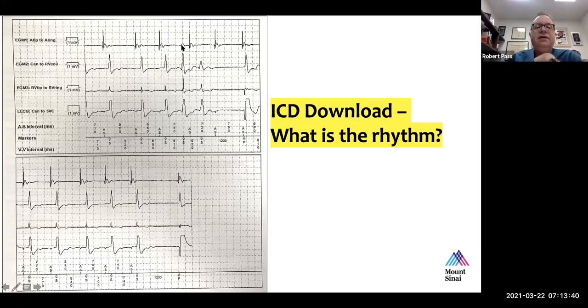What you're looking at here is the far field ventricular electrogram. So let's look at the sinus beat at the start. I think you would agree that this is the atrial electrogram from sinus. But what's interesting is that you see this deflection, this small little signal that looks almost like a P wave, as you described it, that is on time with the QRS.